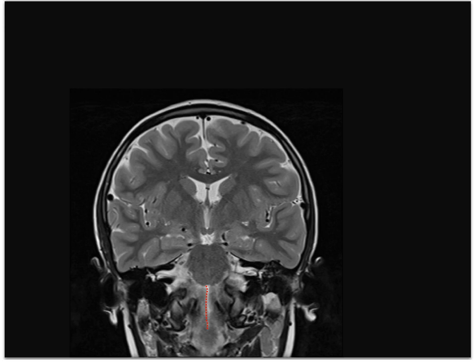Anterior median sulcus of medulla separates the pyramids. The pontomedullary junction is the site of exit of the abducens nerve, or sixth cranial nerve. Trigeminal nerves, cranial nerve 5, are visible in the cisterns and are heading anteriorly to enter Meckel's cave.